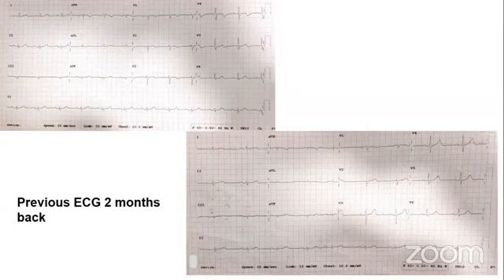Okay. I'd like to request Chaudhry Hafiz sir to say. It's important to recognize this nature, because sometimes there is a deep T inversion, and we need to distinguish the cerebral T wave from Wellens. This is a classic biphasic presentation. So it is a proximal ostial LAD until proven otherwise. And if the clinical picture is good, then go for it.